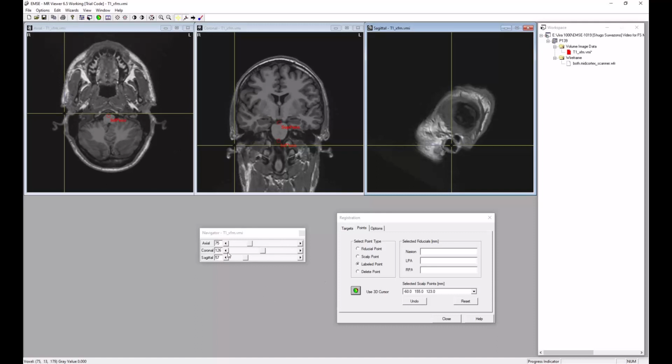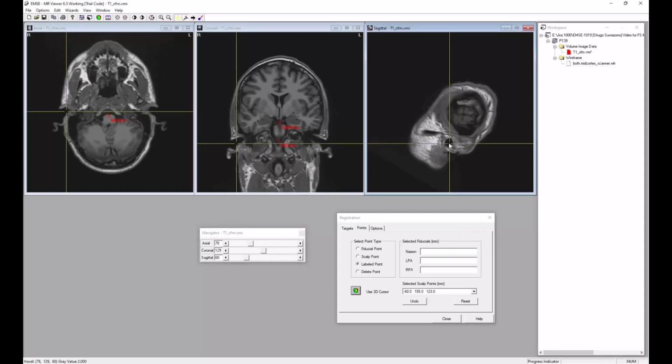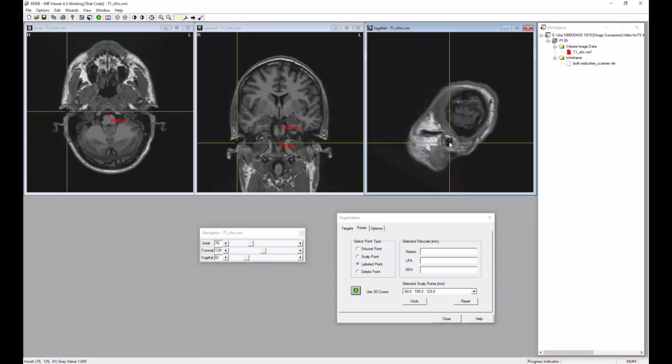But what I do, let's see, sagittal, let's move it out so that I'm only seeing one hole instead of what I mean by that. If I go inside, now I'm seeing like two compartments of the ear there. I'm moving out as far as at least, so I'm just seeing one. Centering it there, and it's roughly where the point of exit. So let's mark this one.